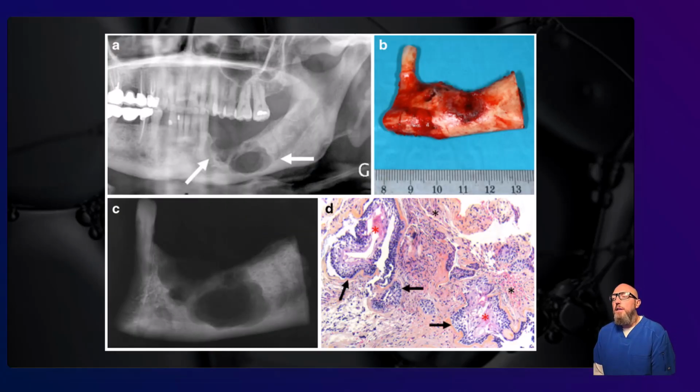All right, what does this look like? A lot of times the first thing I look at in a radiograph is, okay, what's the age of the patient? This is an older patient missing quite a few teeth, right? Some serious periodontal disease. And then look at the borders of the lesion. Are you thinking more ill-defined or more well-defined? Are you thinking more something maybe malignant or something more benign? And this has nice, clean, very corticated, smooth borders. So something very well-defined, but it is destroying the alveolar bone here. So it's well-defined, maybe a little bit aggressive here.